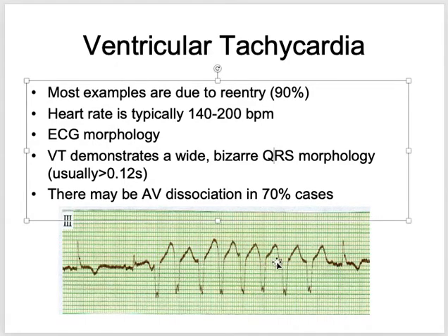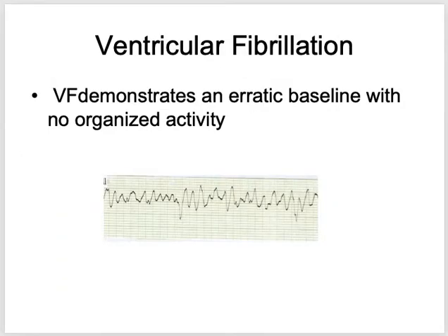You can see the broad QRS complex tachycardia here, a very distinctive appearance on this ECG. It is not always associated with cardiac arrest, but it is a very, very, very dangerous type of arrhythmia. So these two are shockable rhythms. Ventricular tachycardia is a shockable rhythm, as well as ventricular fibrillation. They are both shockable rhythms, in which we use a shock.